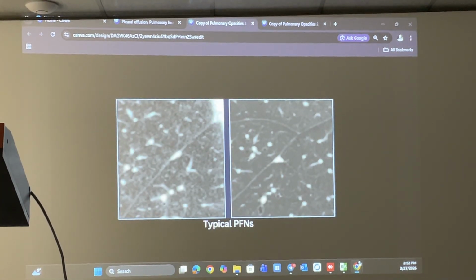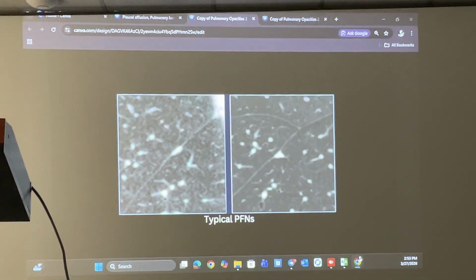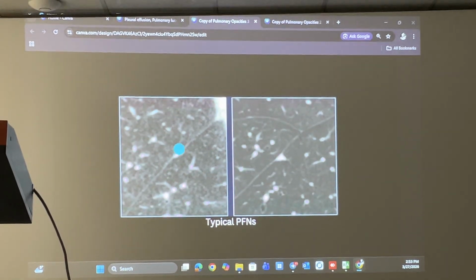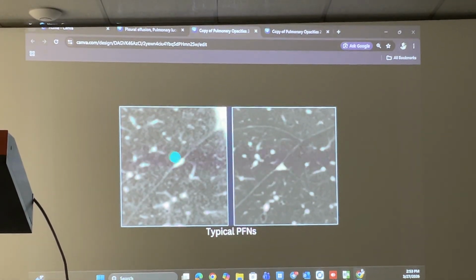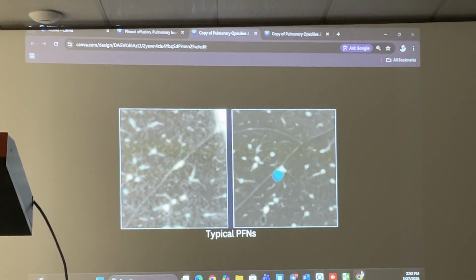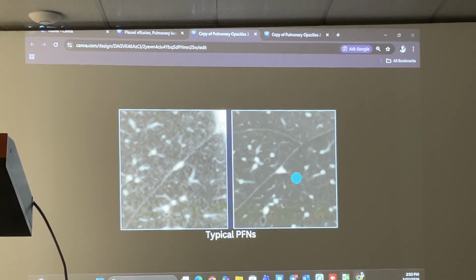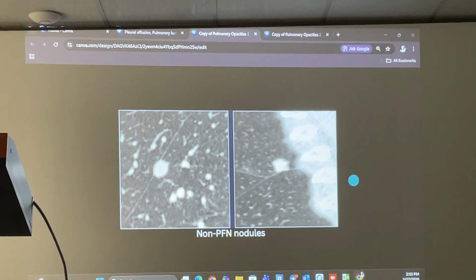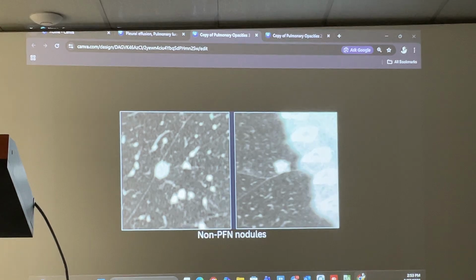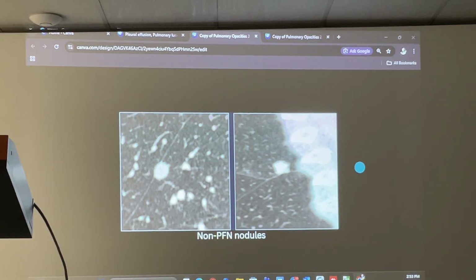Where is the typical nodule? Fissure. Typical. This one? Yes. Again. No, that one. Why? Because only one side is touching and the shape is not typical. Margins are not clear.